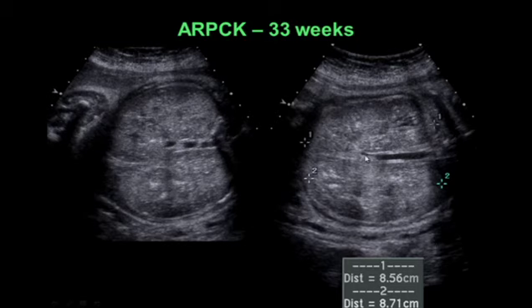You can see these two kidneys measure more than 8 centimeters each, and a normal kidney shouldn't measure more than about 4 at birth. So these kidneys are very long. They're also very wide. You can see they extend anteriorly here and here, filling the fetal abdomen. But these kidneys, although they have a normal renal-form shape, are more echogenic than normal, and they don't produce urine because of the polycystic kidney disease.